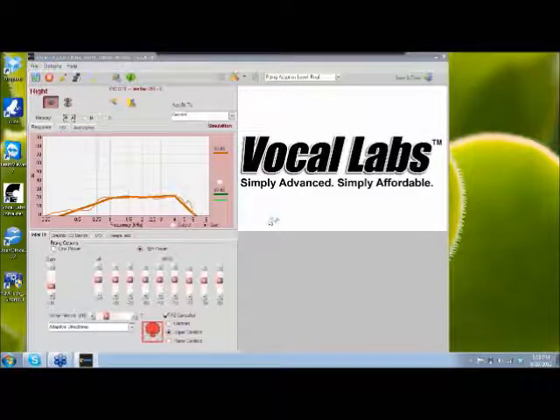When it says, do you want to program the device, say yes, and then it will also ask you if you want to exit the application. You can say yes or no. That is the best way to finish.